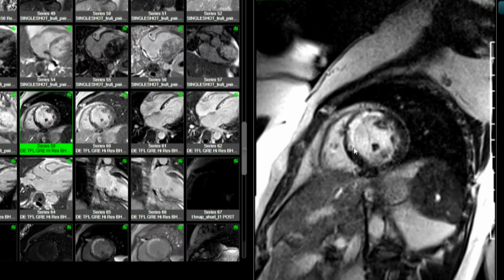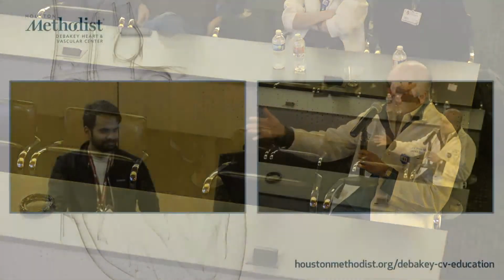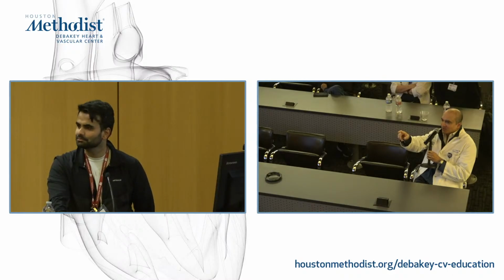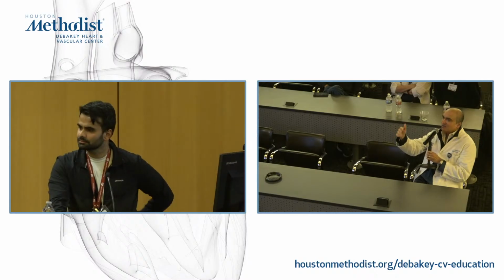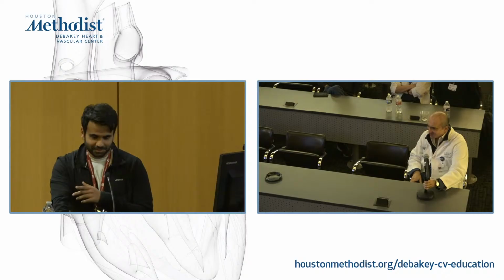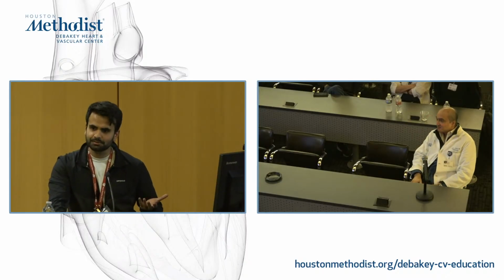Now, Anish, would you say there's scar there, or... I should say late gadolinium. Yes, right, late gadolinium, because this could be acute injury, or it could be chronic scar, so don't use the term scar. In this case, from the clinical presentation, and from the fact that you're seeing alteration in the T2 signal on your cine, suggesting increased water content and edema, you're going to tell me in the end that this is an acute injury, right? Yes. So don't use the term scar. Yes, that is true. So there is late gadolinium enhancement.